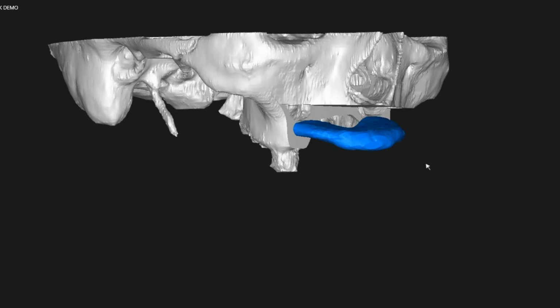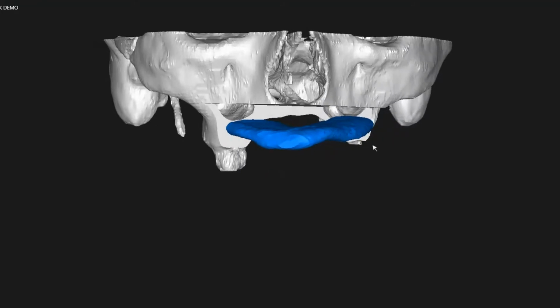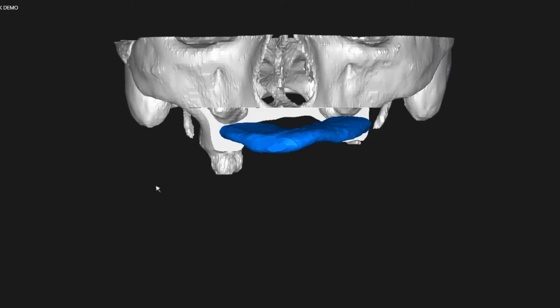Yeah, basically it's very simple. Two 4-hole plates. You have 2 holes on the native bone and 2 holes on the scapula, one on each side. Perfect, that's about it. Give me just a couple minutes and I'll get that set up here. Yeah, that's okay.